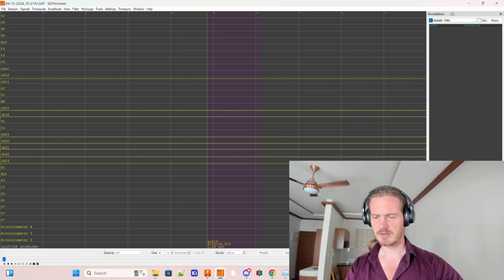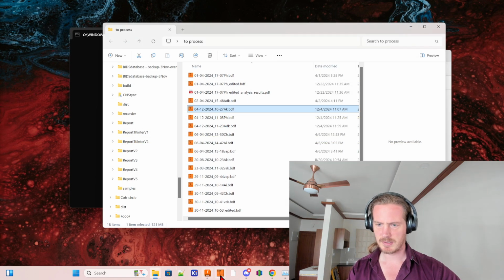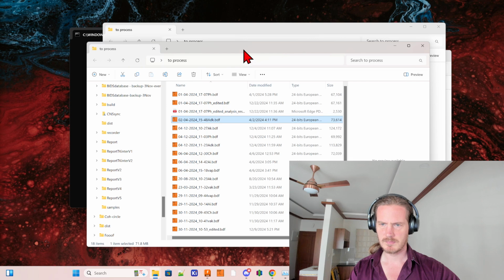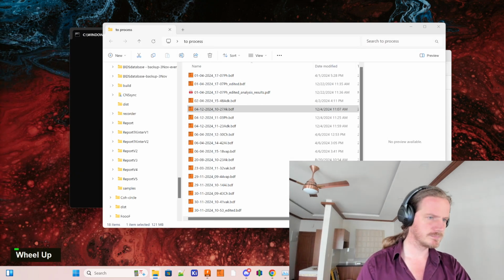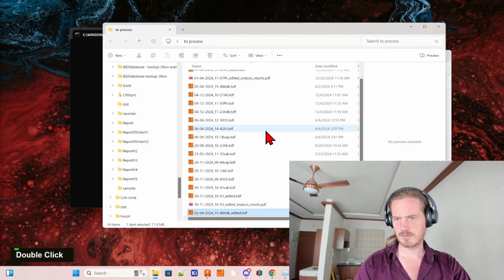Okay, I see what went wrong. I saved it to the wrong location, so I'll just copy it from there. One moment. And there we have it.